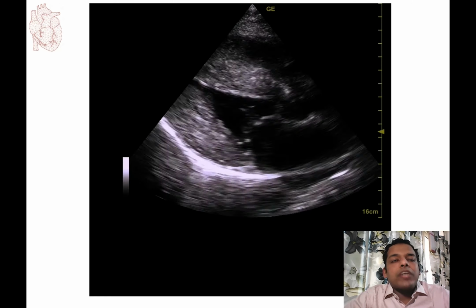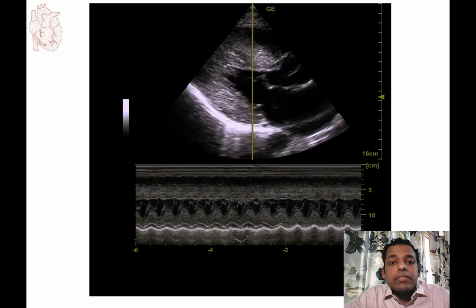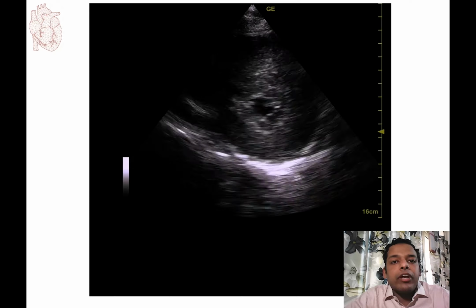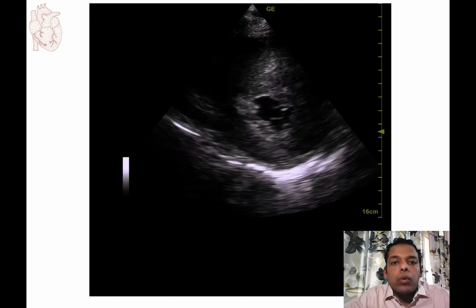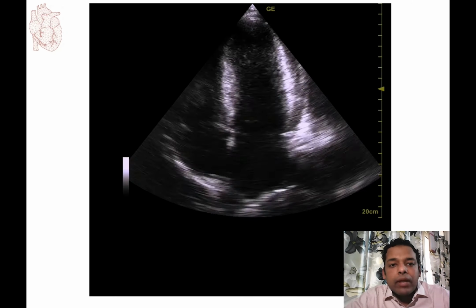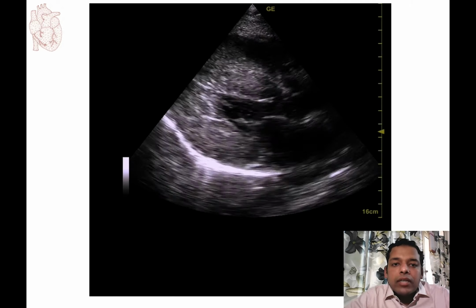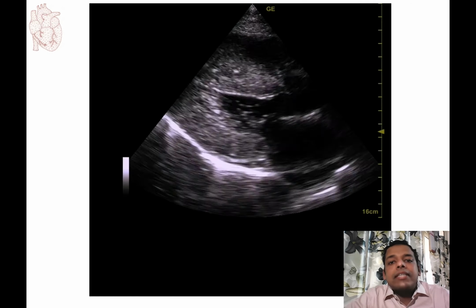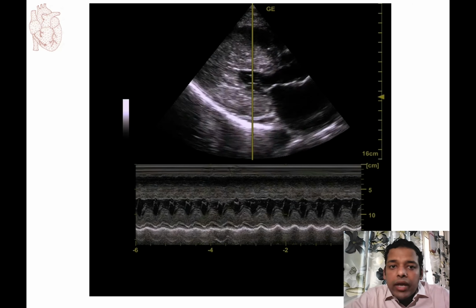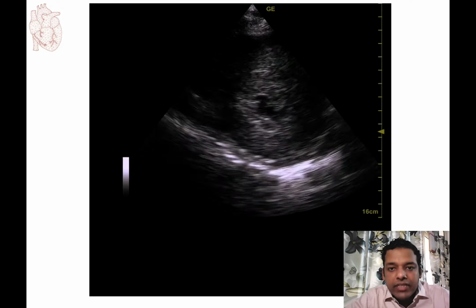Determination of the left ventricular mass has important clinical implications, especially in hypertensive patients. The presence of hypertrophy has been associated with worsened outcomes, and its regression has been a goal of therapy. The determination of left ventricular mass can be done by assessing the wall thickness of the left ventricle. A good way is to see the wall thickness in relation to the left ventricular cavity.